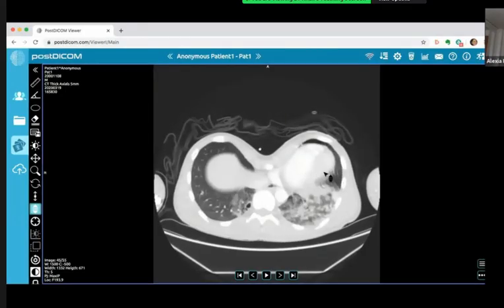And there was a small left pneumothorax in the apex. So well done. You just need to keep looking for more with these trauma scans. And this is pectus excavatum, right? Yes, well done. Significant pectus excavatum. Great.